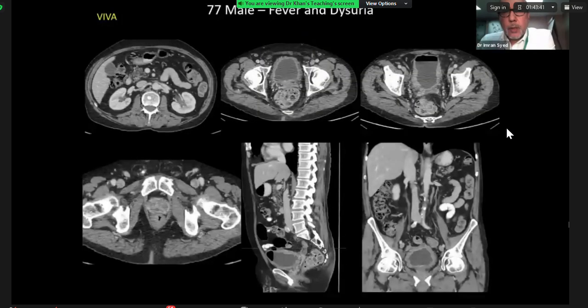Oh, sorry. So this is an inflammatory process affecting the bladder. So you've got some sort of granulomatous cystitis, and obviously anything that becomes inflamed, in terms of the visceral invasion of or involvement of the bladder, can backtrack and involve the prostate, and therefore there's two visceral organ involvement, and that's the key here. So the pathology is one is intimately related to the other, and that's the take-home message.